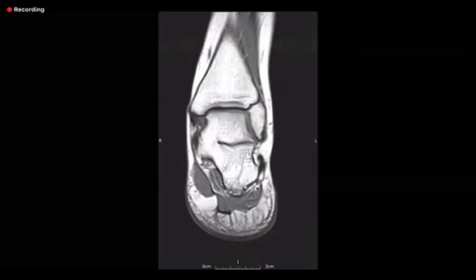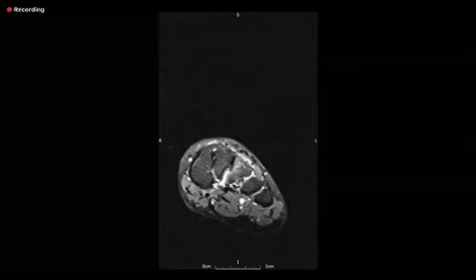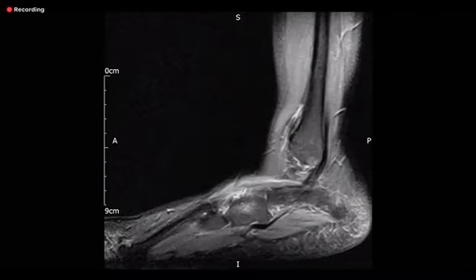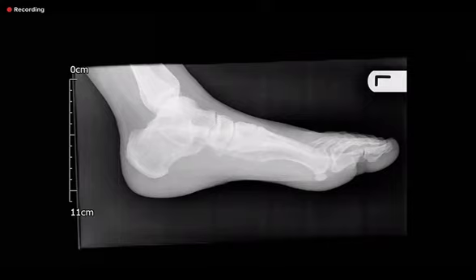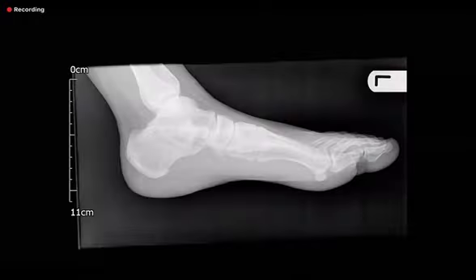So there is talocalcaneal coalition, but I will go through it, and please remember it's a very important exam case. I'll tell you what Viva questions will come from this. Now, the key finding is talar beaking. Keep your eye open about the clinical: a young patient with this kind of thing, the examiner is going to initially start with a lateral. And on a lateral, the main thing is talar beaking.